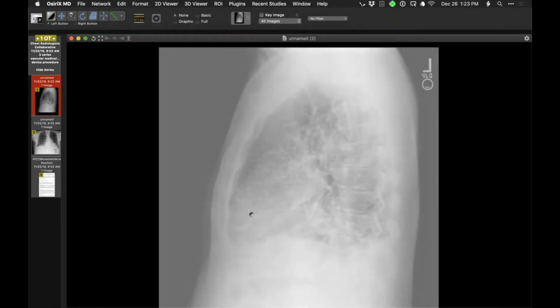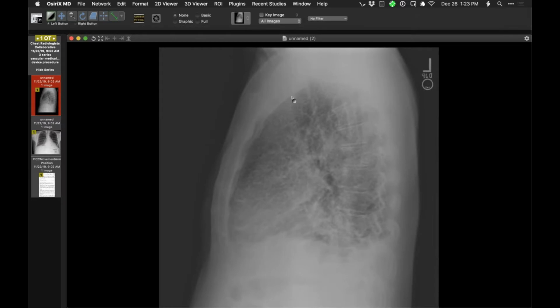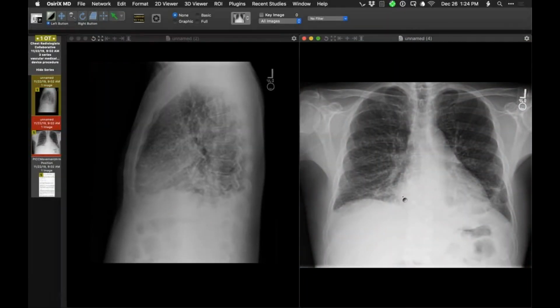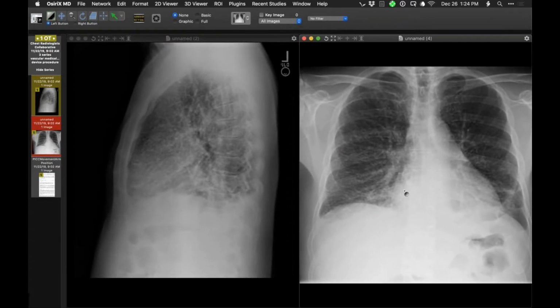Same exam. Where is it? It's called up here somewhere, but it's not here. So it seems like when he pulled his arms up, it flipped up completely. It just has to be up here somewhere. Some of it could just be in the subclavian vein that you're seeing there, but I agree, you don't see the tip anymore. I'm wondering if when you pull your arm up, do you essentially pull it further into the arm? No, it usually moves down.